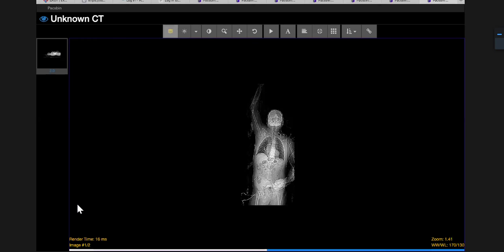Tell me about the protocols that are used as a standard for trauma scanning. So I think the very recent guideline says that the scanogram has to include the whole of the body until the toes, because then we have to know whether there are any distal fractures, for example, and then we can decide whether we are going to go all the way with the axial slices or just stop at a certain level. So I think the scanogram is not sufficient according to the new guidance. Well, this is quite an old scan, so that's fair.